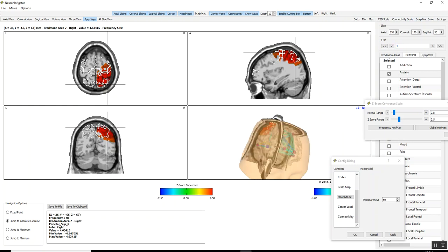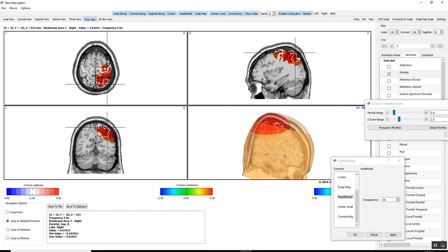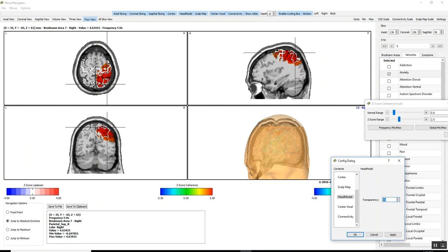So that you can see the connectivity, you can see the current densities. We can activate our scalp model. You'll see where the current density is deviant from normal. The connectivity, see where it's deviant from normal. You'll need to make more transparency changes in the head model to do that. I'm going to make it 70% transparent, or just get rid of it.